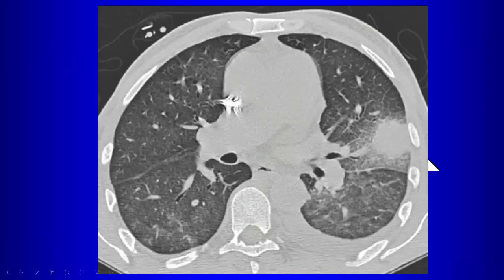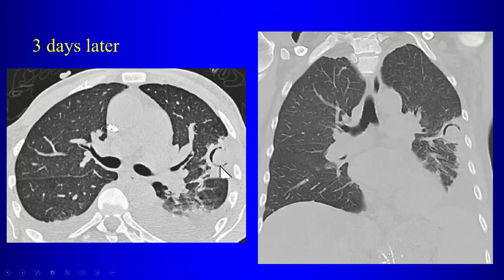So it starts out as a nodular lesion or nodular mass-like consolidation with peripheral ground glass halo representing hemorrhage around the lesion. And then the patients start to develop the air crescent or the peripheral cavitation, which tends to coincide with what? Improvement of the white count. These patients are neutropenic, and as the neutropenia gets better, then they tend to mount this cavitary reaction to the infection. So this tends to coincide with the white count going back up in these patients.